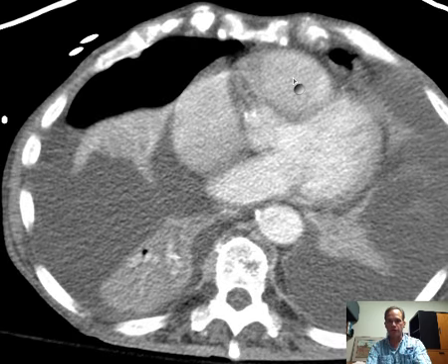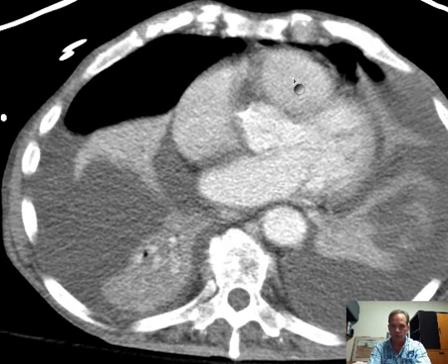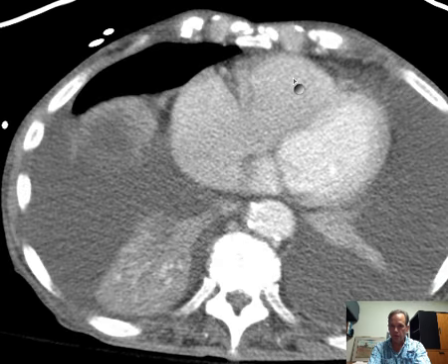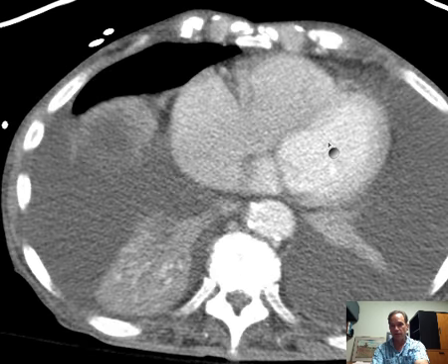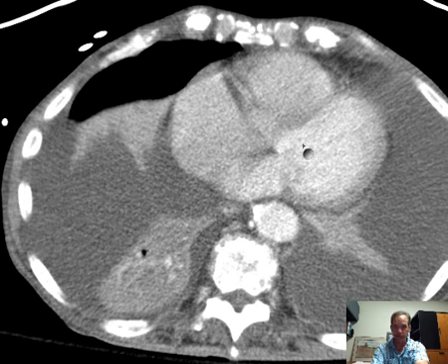But focusing on the ventricles for our present purposes, take a look and you'll see the left ventricle is going to give rise to what vessel? The aorta or the main pulmonary artery? Well, the left ventricle supplies the whole body. It better have oxygenated blood because it's going out to your brain and kidneys and such. So let's see where that goes.